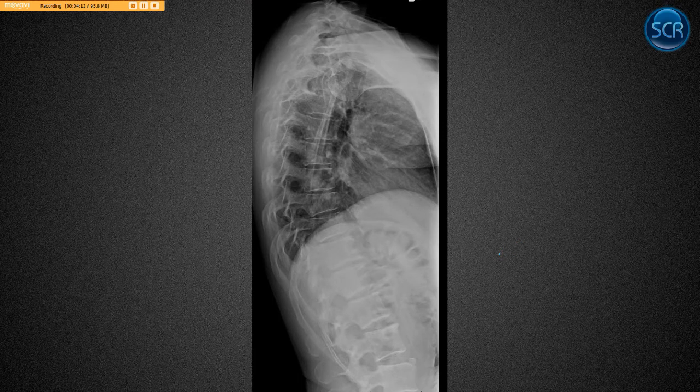So here's another example. This person, again, had multiple myeloma, if I remember. And we look through here. These all look pretty normal. We get to this one, decreased vertebral body height, wedge deformity. So this is a compression fracture. They've got a limbus bone down here as well.